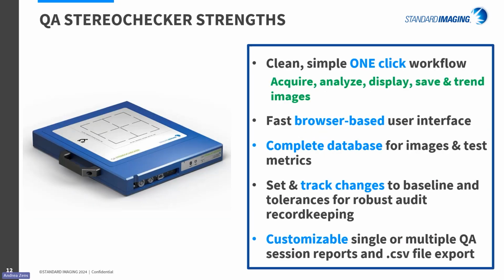The workflow is so streamlined and automated that one click gets it done. It has an easily navigable browser-based user interface, a comprehensive image and metrics database, and customizable reports to meet robust audit record-keeping requirements.